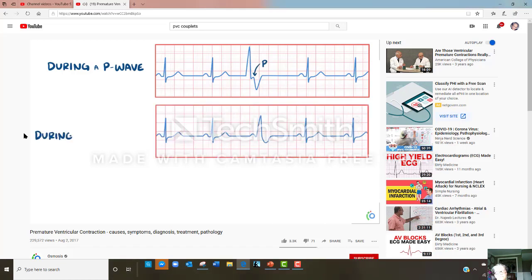Next, the ectopic beat could happen during the PR segment, and because the ectopic depolarization happens relatively slowly, oftentimes it will combine with a normal depolarization wave coming down the ventricular conduction system, resulting in a ventricular fusion beat. These can appear lots of different ways, depending on where the 2 depolarization waves meet each other.